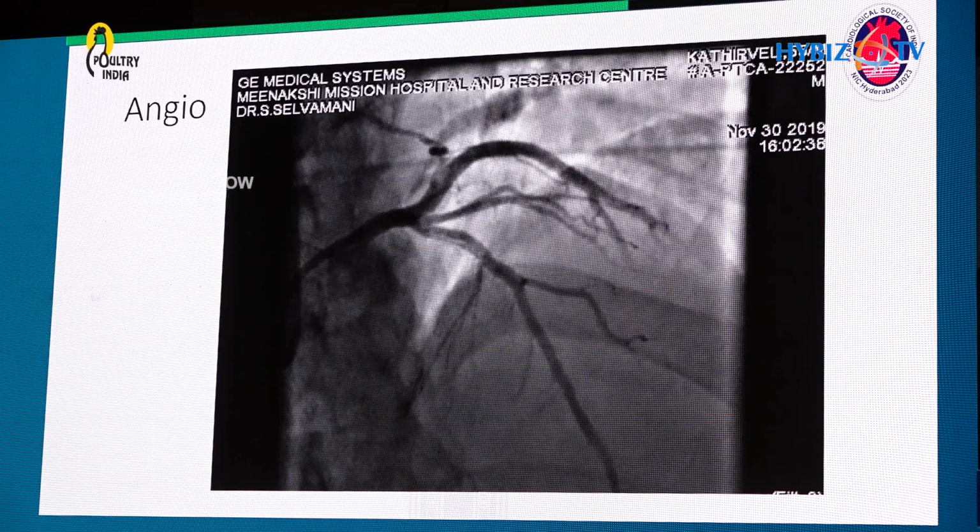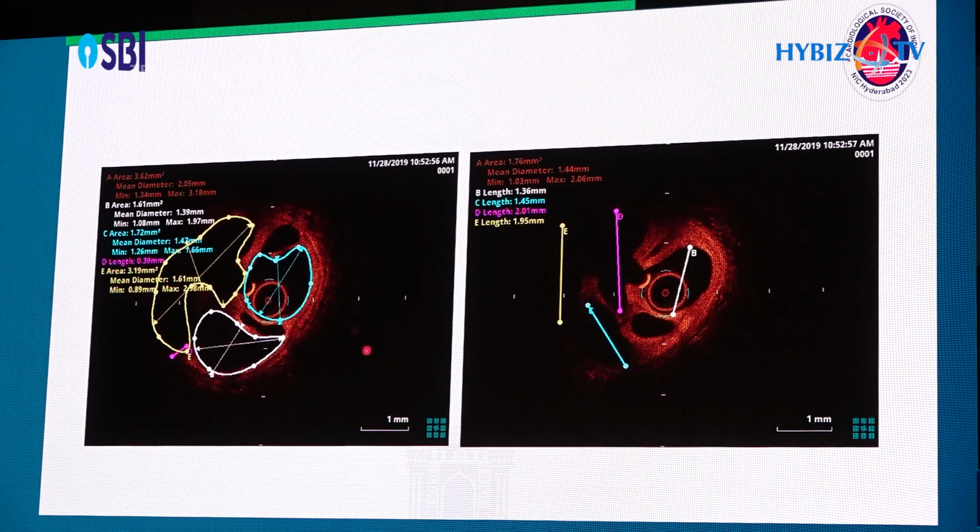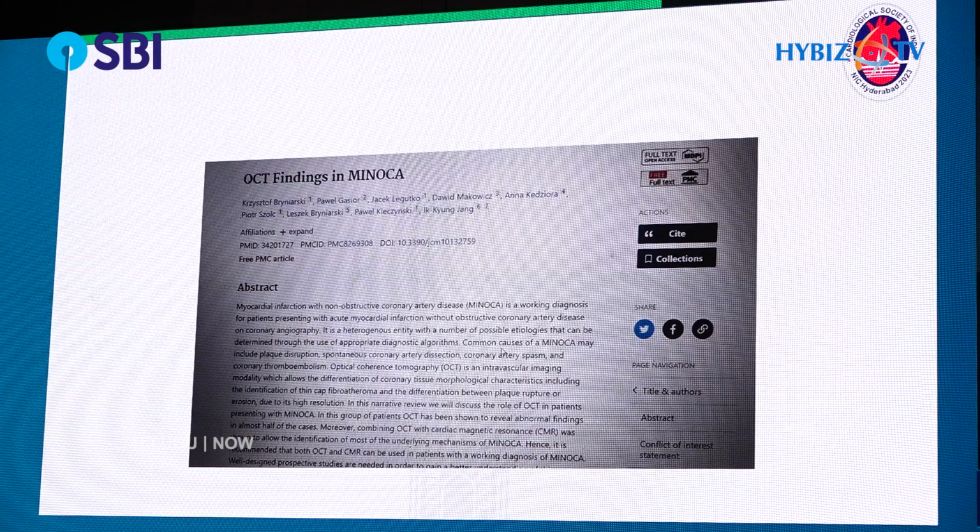In this type of patients, you can decide whether to treat it or not. Probably many times the FFR is positive in such cases. Or you can look at the effective lumen area. You can measure all the lumens of the recanalized thrombus, look at the effective lumen area, and take a decision whether to stent it or not. So this is a thing.